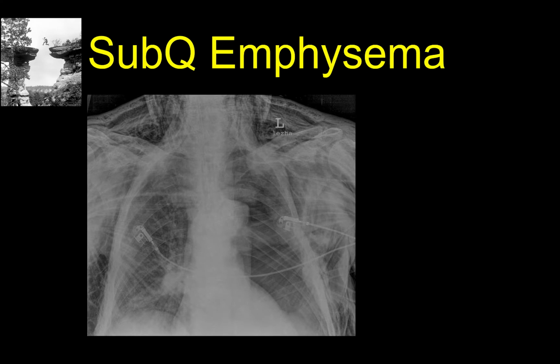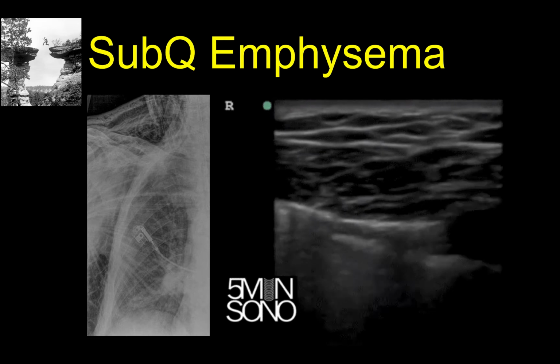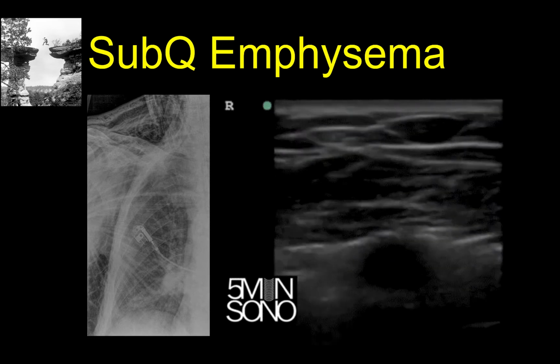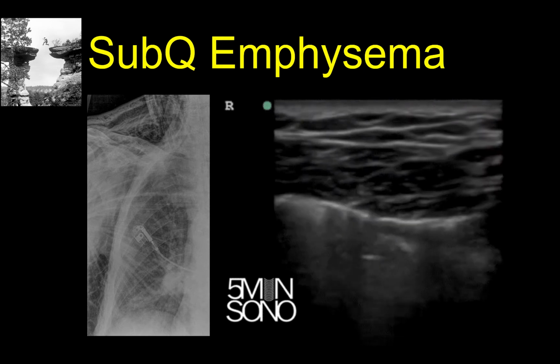The first one to be aware of is subcutaneous emphysema, which often accompanies a significant traumatic pneumothorax and can make ultrasound very difficult. Here's an example. What you're seeing here is something that looks like the pleural line, outlined in blue. But notice at the end of the clip that this lies above the rib. This is actually subcutaneous air mimicking a pleural line and is called an E-line.